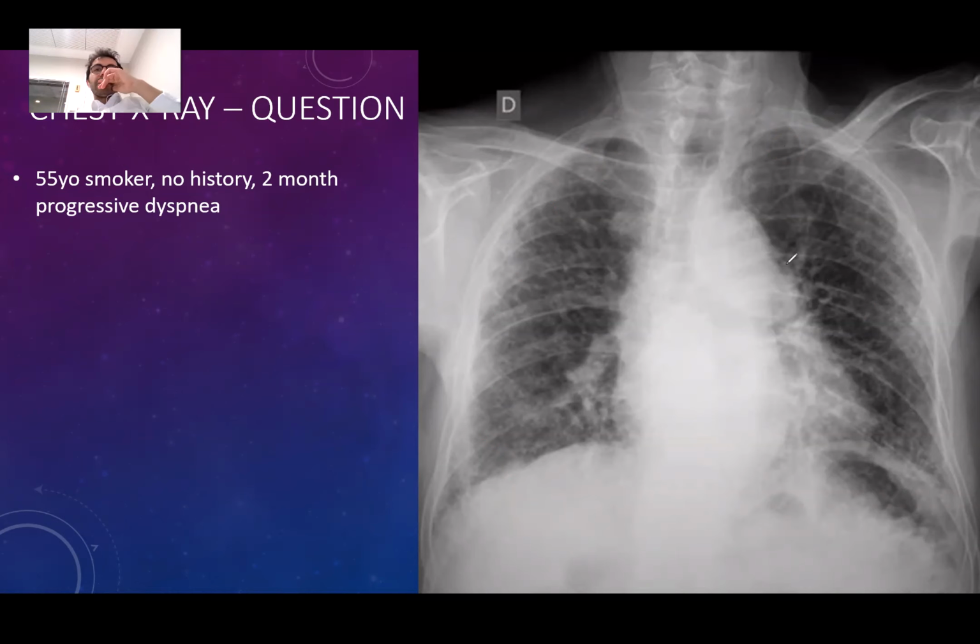So when you're looking at the systematic level, what do you see in this chest X-ray? Where do you want to start? Let's put it like that. If you want to start from the lateral side, like what I said, you can see more dense areas than the medial side. Yeah. And we can see at the hilar region there are opacities too. Yes. Maybe. And on the left side as well. So I think it's systemic, not an infection. Good. Yes.